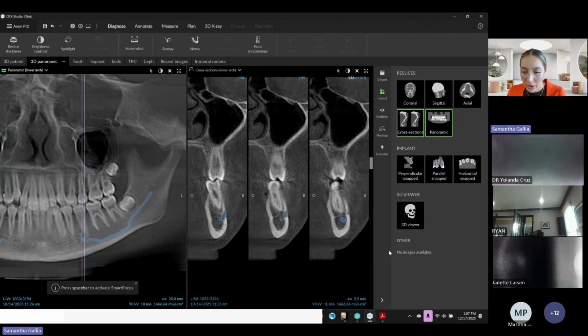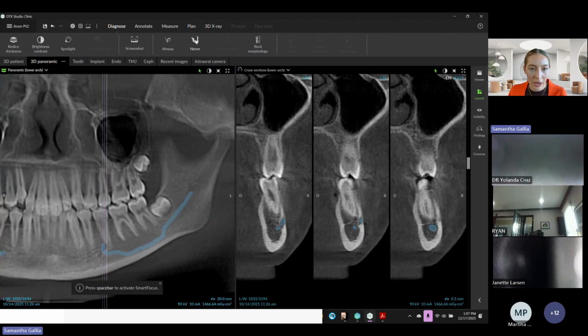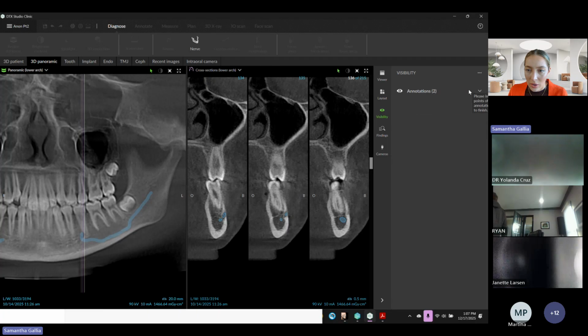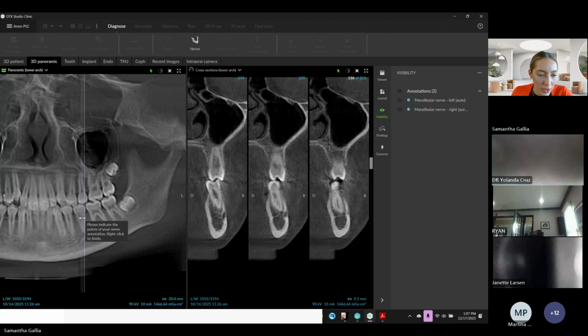And I am going to go over here, small, and then I'm going to go to nerve. I'm going to go ahead and delete the current versions of the nerve. So I'm just going to toggle those off so we can't see them. Then I'm going to hit nerve.